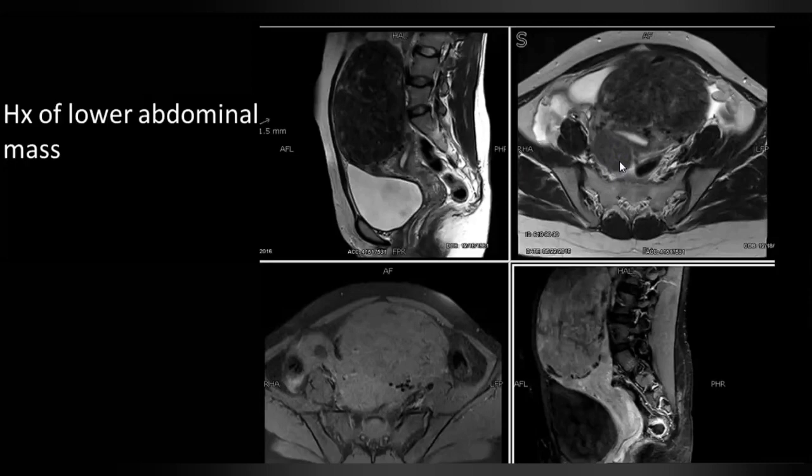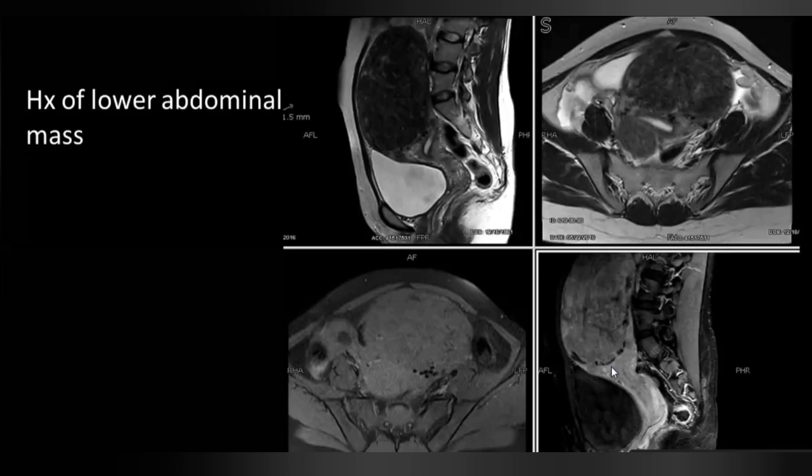So these are the fibroids, and like on ultrasound, fibroids may have different signal intensity on MRI as well. Predominantly they are hypointense, but they may also be hyperintense on T2, again due to multiple reasons. Predominantly they enhance slightly less than the adjacent myometrium, but mind you, fibroids may also sometimes enhance more than the myometrium as well.